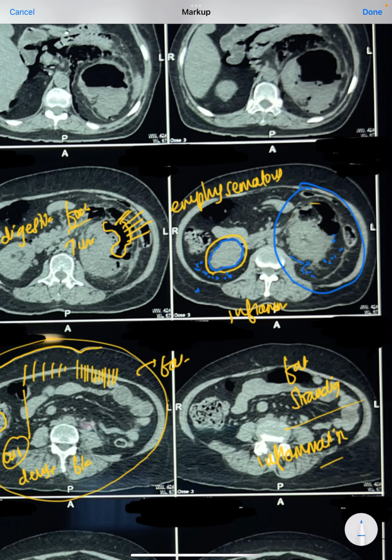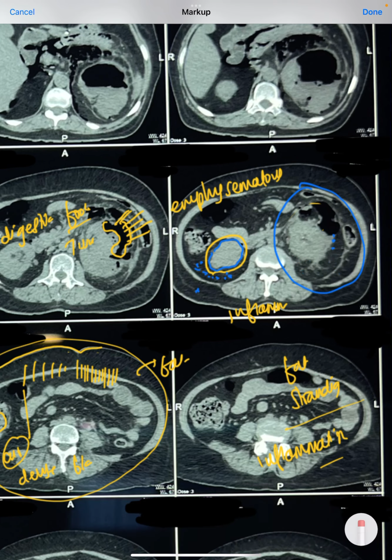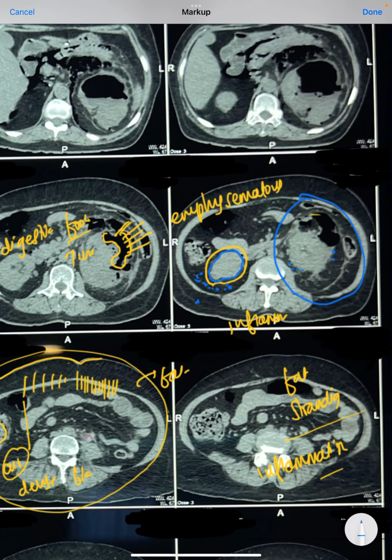So this is all fat, and in this fat you have these whitish streaks, whitish bands which are there. So the margin of the left kidney is not at all smooth. It is so irregular, and there is dotted nodularity, which tells that there is active inflammation going on around the left kidney, and there is fat infiltration by inflammation, which suggests that there is active infection.